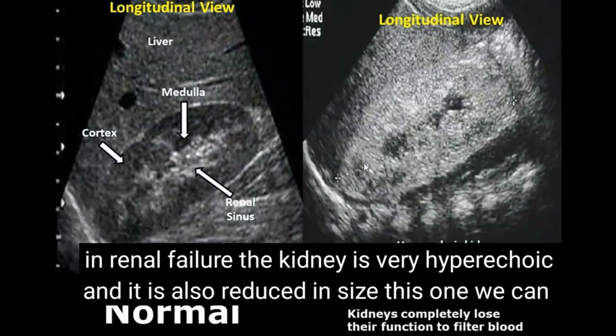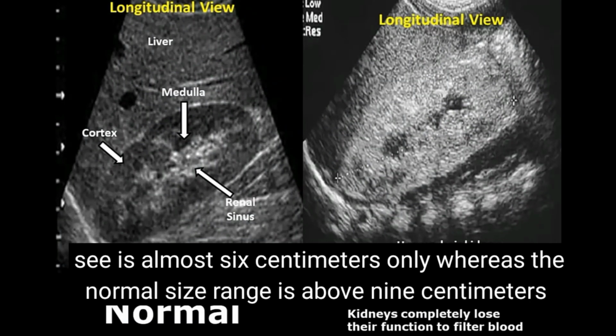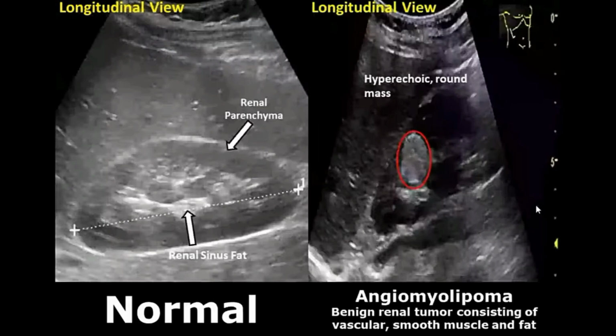In renal failure, the kidney is very hyperechoic and it is also reduced in size. This one we can see is almost 6 centimeters only, whereas the normal size range is above 9 centimeters.